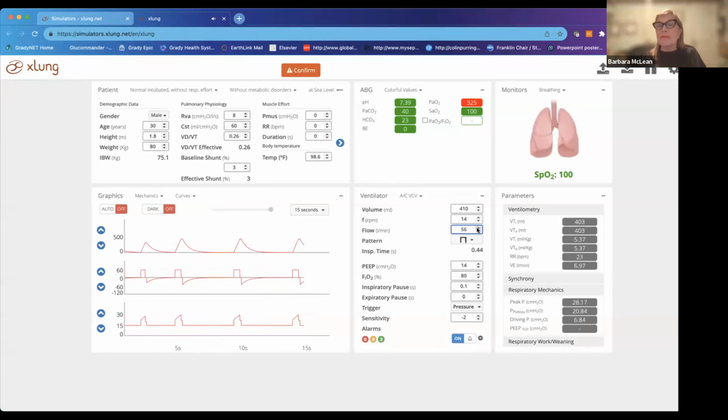And I'm going to increase his flow to about 65. And you can see your patient is extraordinarily well oxygenated. So I think I need to go down on his PEEP. And of course, I would never do it this quickly on a real patient. This is just a simulator because his PO2 is too high. It's washing out his nitrogen. And I'm going to go down on his FiO2 to probably about 65 just for now, because I want to see how he's going to respond.